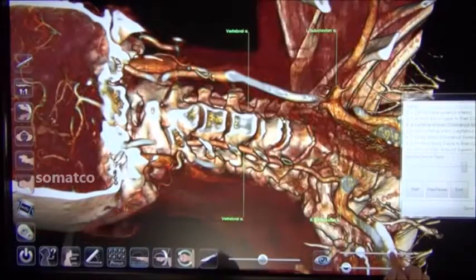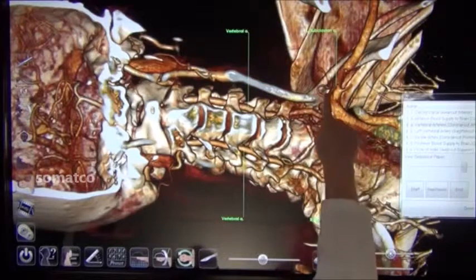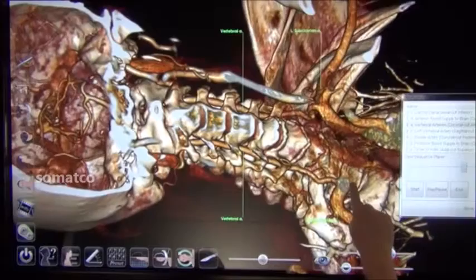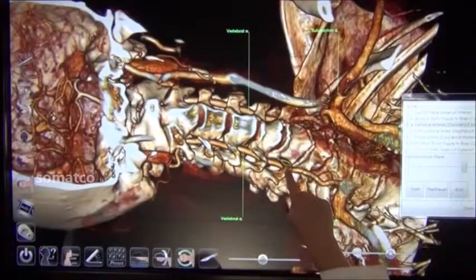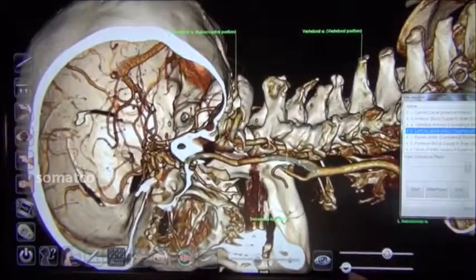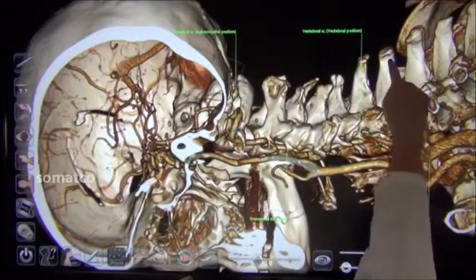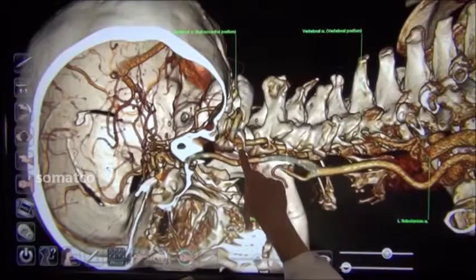The vertebral artery will course superiorly off of the subclavian arteries on both the right and left-hand sides. Often we'll see that it skips C7 and will not pass through the transverse foramen at this level. Rather, it begins its ascent in the transverse foramen at the level of C6. Here we see a view of the left vertebral artery coursing past C7, which we can identify with the vertebra prominens, and ascending superiorly towards the skull.